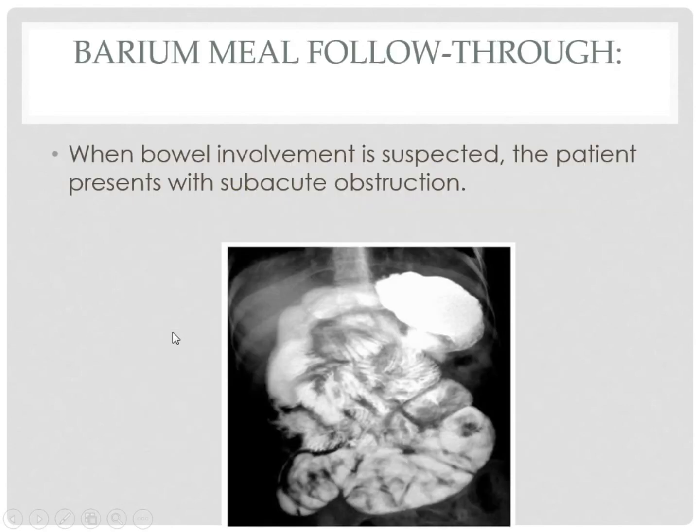Barium follow-through. When bowel involvement is suspected, the patient presents with subacute obstruction. So what do we see here? The small bowel looks a little bit dilated, and they are coalesced in the center of the abdomen, clumped together, right? Yes.